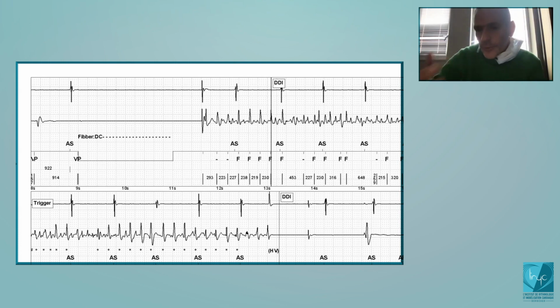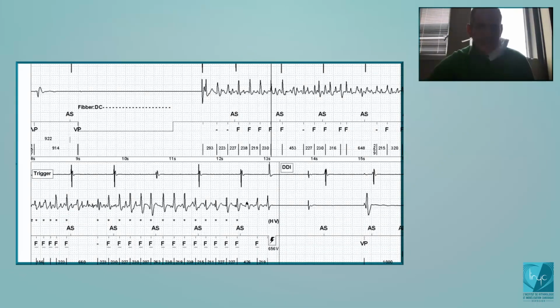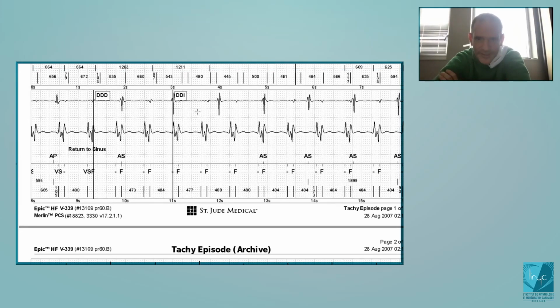Okay, that's the main advantage of the way they count. Okay, that's clear. Yes. And at the end, the shock here is delivered. But that can be an advantage, but that can also be a limitation. So explain to me, what do you think about this tracing?